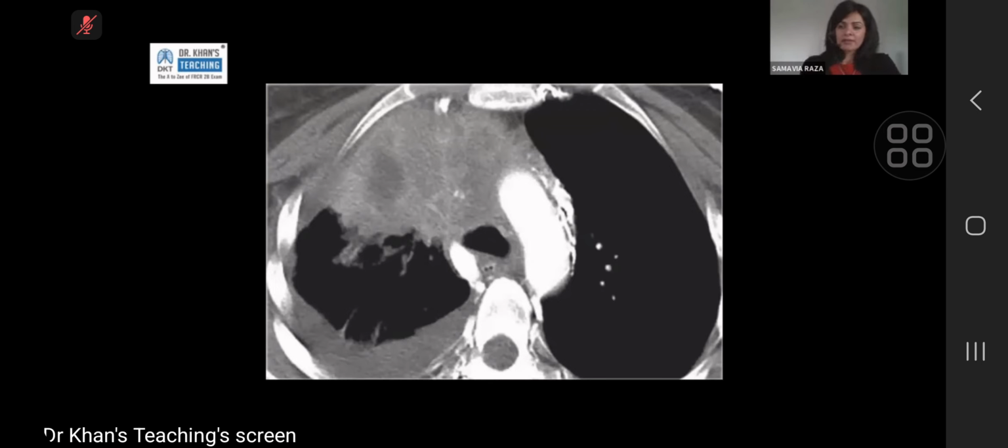Infection respects the anatomical margins. So a lung area of consolidation, or what you think is consolidation, almost has necrotic-looking areas within it, but is involving the mediastinal fat, has infiltrated the mediastinal fat, and in this case is also inseparable from the arch of the aorta, is highly suggestive of lung cancer.